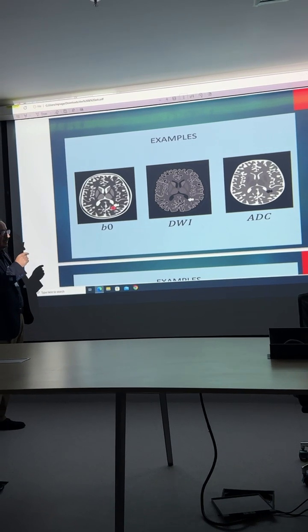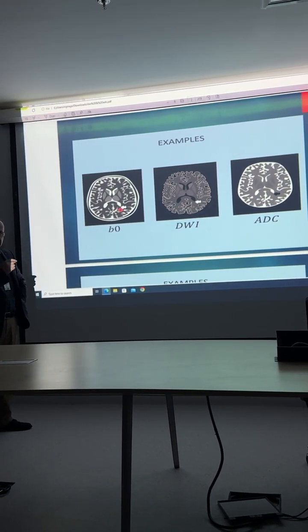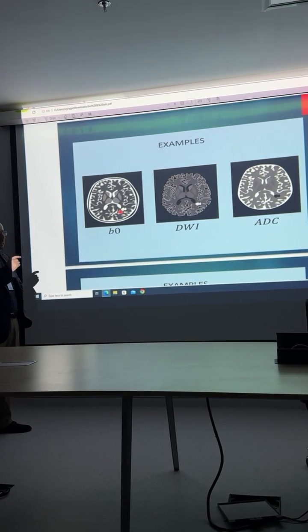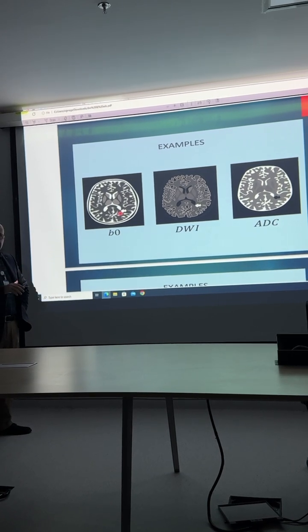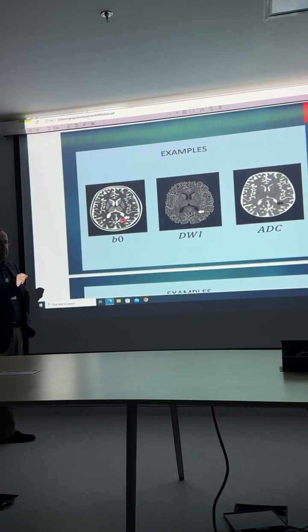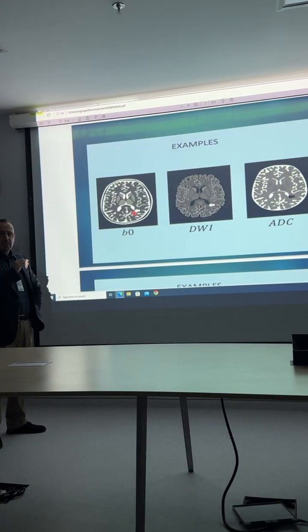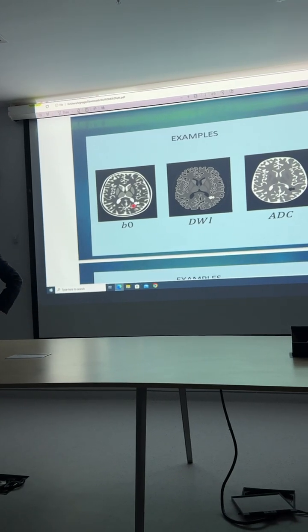The ADC determines whether the region is due to restricted diffusion or T2 prolongation. Once the signal is dark on ADC, the conclusion is that this lesion represents a restricted diffusion pathology, which in this case is the result of an acute infarction.